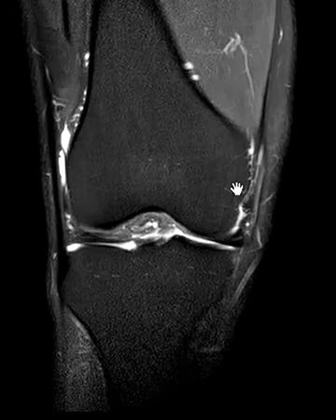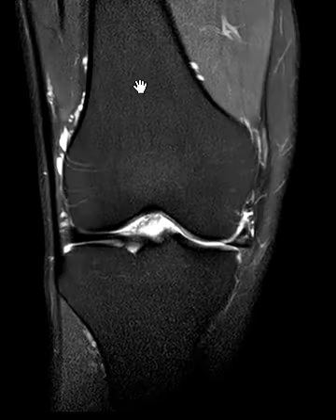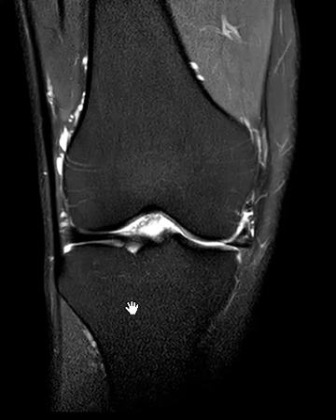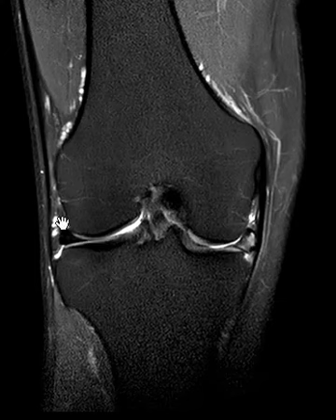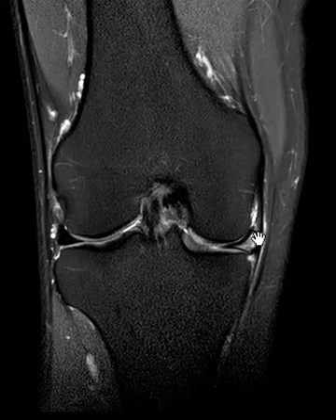This is a view called a coronal, where we're looking straight at the knee. The femur again is up here. Tibia is down below. We see the lateral meniscus, looks pristine, nice, perfect black triangle fitting between the femur, which is round, the tibia, which is flat, a little wedge that fits in there. But look on this side, something is not quite right. We have this glob of brightness.